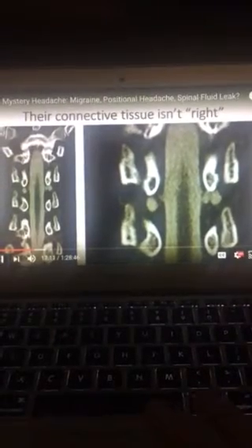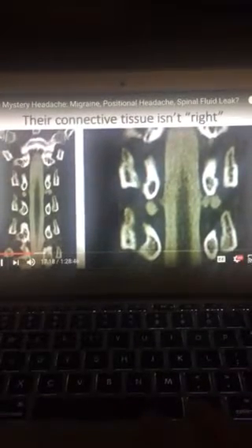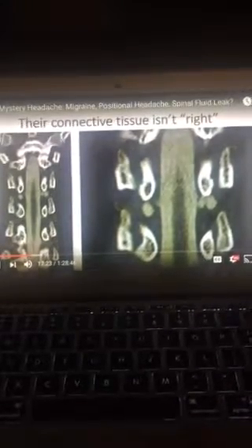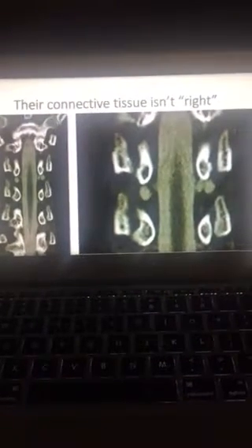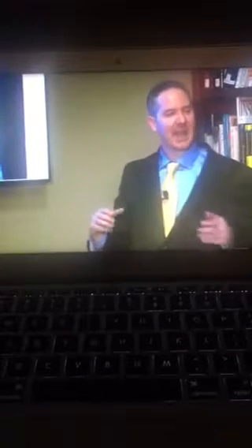What we see here are these kind of lobulated structures that have the contrast in them. The contrast is no longer confined just in the bag of fluid. It's starting to get into these nerve root sleeves and these dilated, bulbous-looking structures. That is essentially an aneurysm. It's an aneurysm of the bag of fluid. It is an aneurysm of the thecal sac.